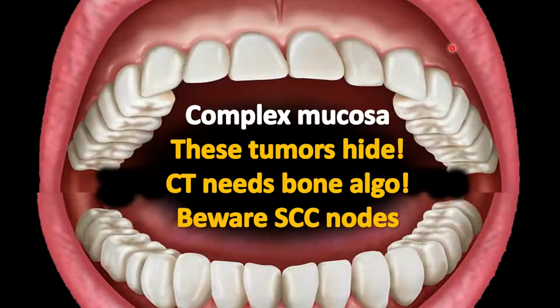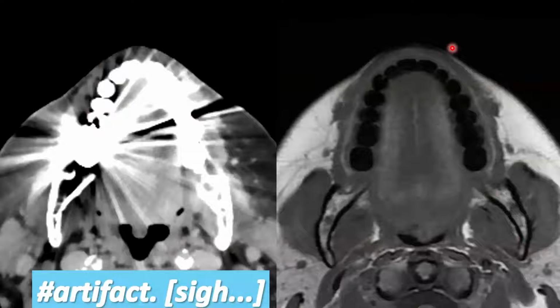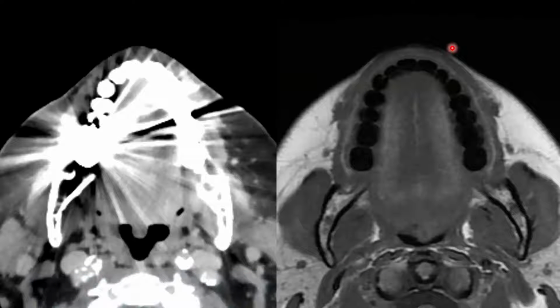And as with any time you're trying to stage a cancer or look for recurrence, you've got to be very careful with the nodal disease that you see with oral cavity malignancies, because it's frequently very small and pretty subtle. Look at that artifact. This is one of the problems when you do CT, which in the same patient on MR can be crystal clear, and things are pretty easy to look at. But let's start trying to understand some of those mucosal surfaces.